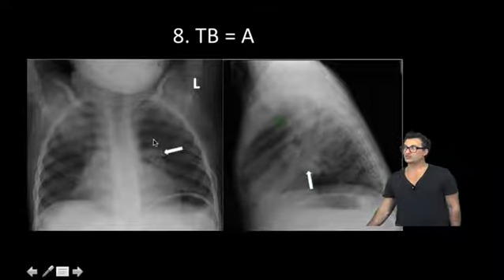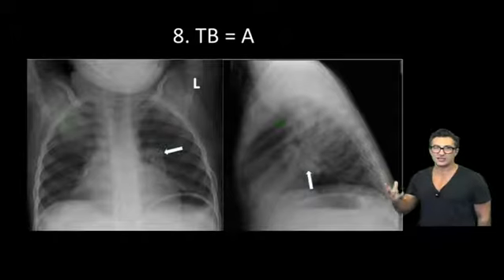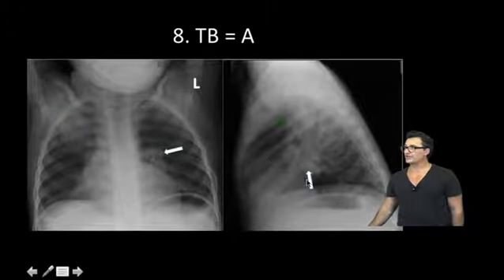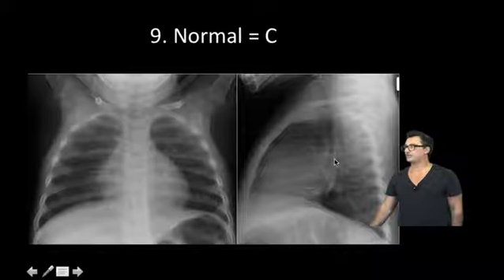You see it's lobulated, it's convex outwards. There's basically a cauliflower, as I've shown you, sitting in the hippopotamus mouth. And if you're comfortable with the lateral, I guess these are soft tissue masses also on the lateral. So for me, this is TB, mainly because of the frontal film on the left.